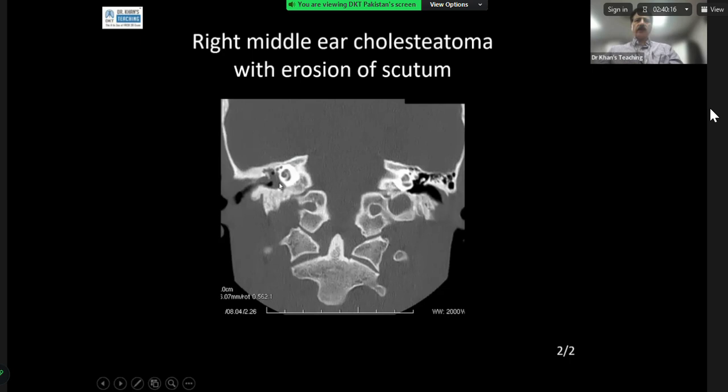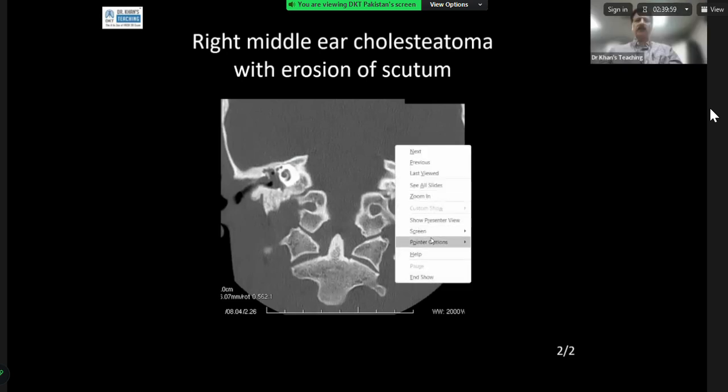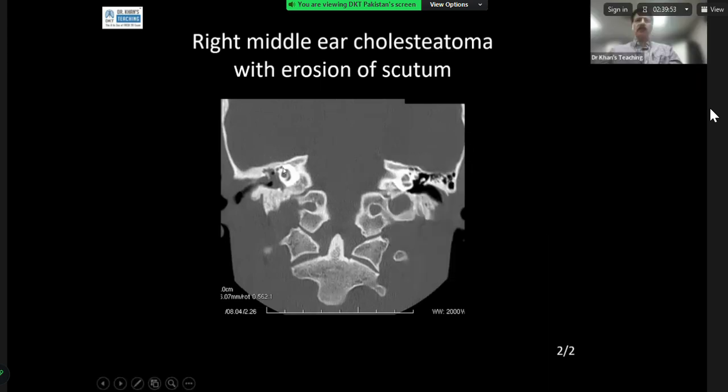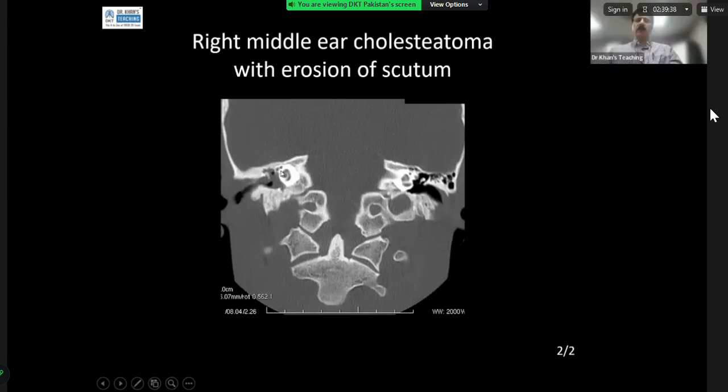We will come back to cholesteatoma, but right now, what is this? There are two dots here. The medial dot, and this is the lateral dot. What is the medial dot? They have to be the semicircular canals. Semicircular canal? Let me see. You see this one, the medial and the lateral. Two eyes, isn't it? Yes. Okay, they are the base of the cochlea. That is fine. So we'll come back to these two eyes, right?